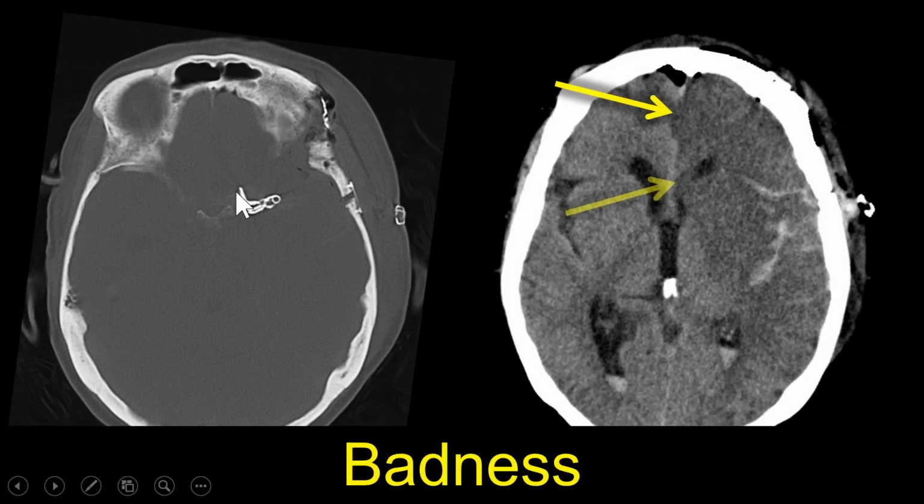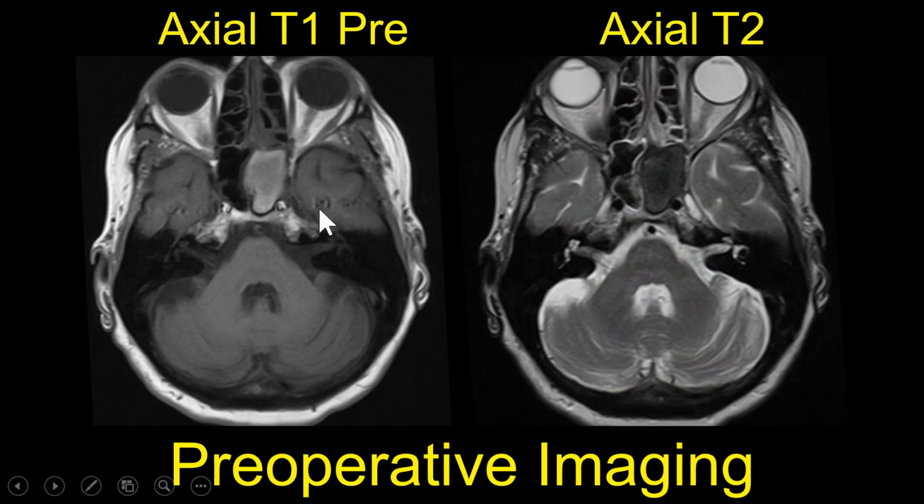So this is a very bad outcome on that case that we had, unfortunately, where the carotid just fell apart because of essentially sinus disease. This was fungal sinus disease that invaded the cavernous sinus and led to a fungal aneurysm. But we didn't recognize the importance of the sphenoid sinus disease, that wasn't recognized on the preoperative imaging.